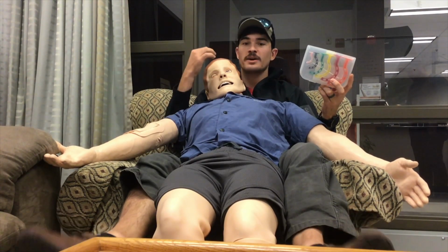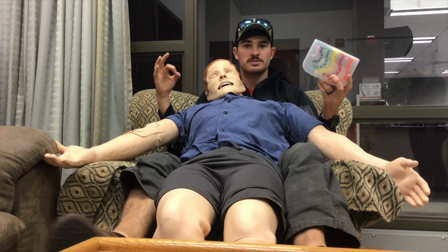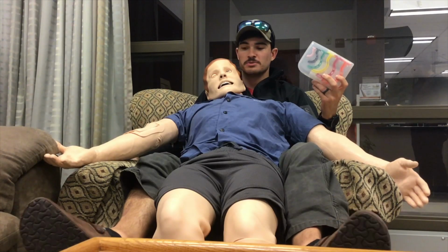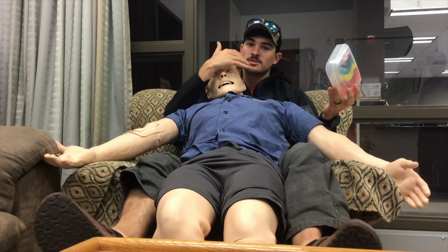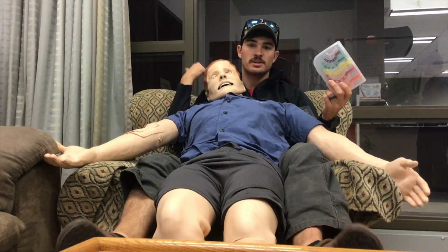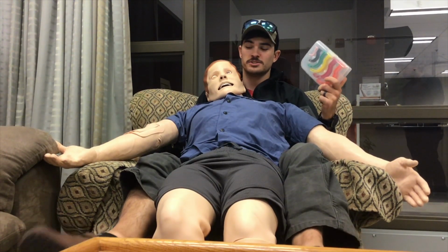These OPAs are meant to grab the tongue and move it forward, opening the airway, but if you have a food bolus or something that's stuck in there, don't use it. Complications would be obviously a gag reflex, we don't want them to aspirate again, and then oral trauma. Say they had some sort of facial trauma, tongue laceration, anything like that, that blood will end up going in the back of their airway and causing an issue or an obstruction.